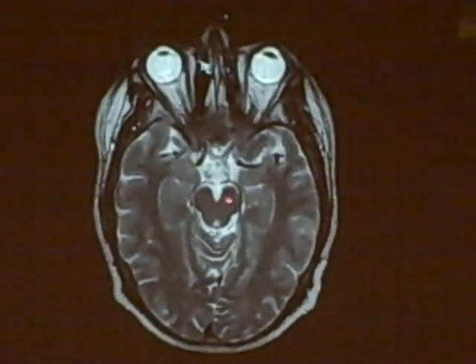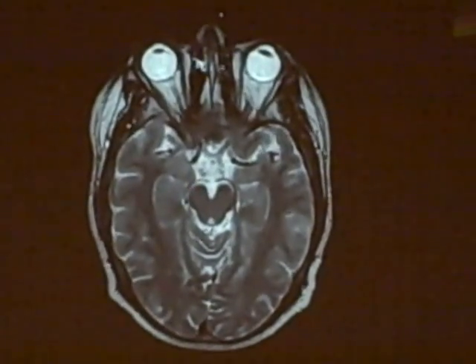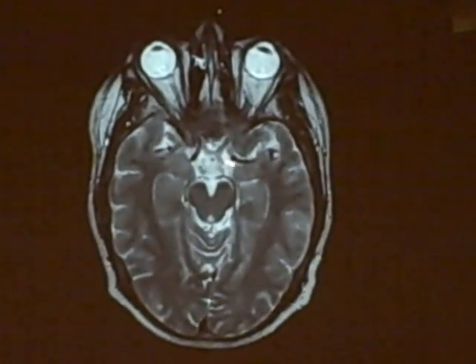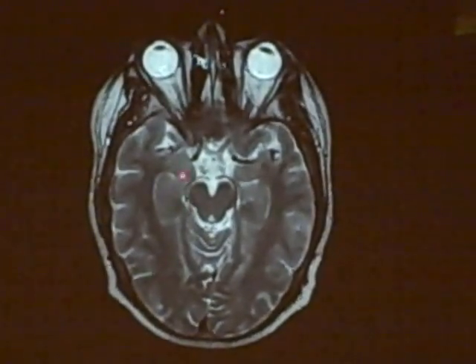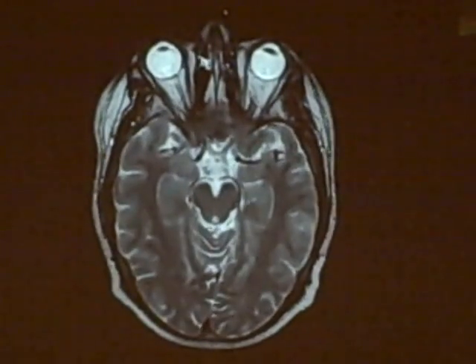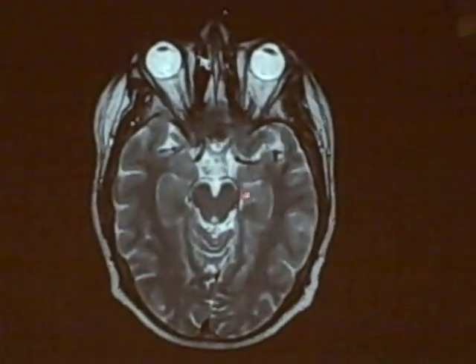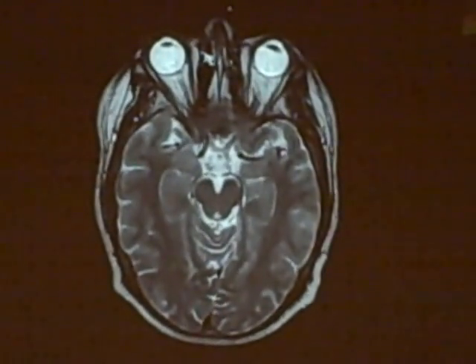Now this is the midbrain, so here's the cerebral peduncle. And so flowing blood on MRI, remember it looks black. And so the blood vessel wrapping around the cerebral peduncle here is the posterior cerebral artery. And the basilar artery goes up all the way to the midbrain, and then it terminates as the posterior cerebral arteries, which wrap around the cerebral peduncle and eventually are headed back to supply the occipital lobe back here.